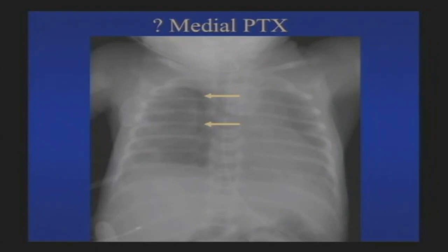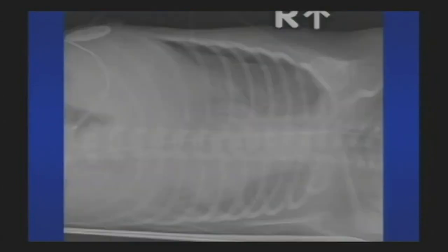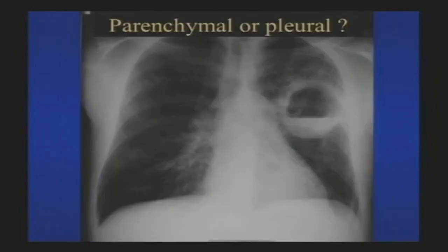And this is particularly problematic in kids because pneumothoraces go into weird locations. So here's a decubitus view in this kid, and clearly that lucency, which could have been pneumothorax or pneumomediastinum, was a pneumothorax. And this is a surfactant deficiency kid. They actually behave in some ways similar to ARDS. And when they develop alveolar rupture because of those non-compliant lungs, you almost always have to put a chest tube in because you're not going to be able to ventilate them without having high pressures.